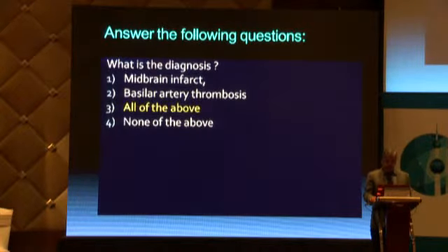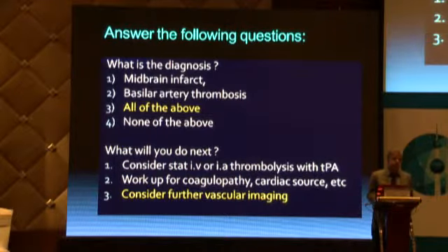So, how will you treat this? Obviously she was not an acute case of infarct. She wasn't so bad. She just had diplopia, was otherwise normal. And it was surprising for the extent of midbrain infarct. She had very little symptoms. So we considered further vascular imaging. So let me show that to you.